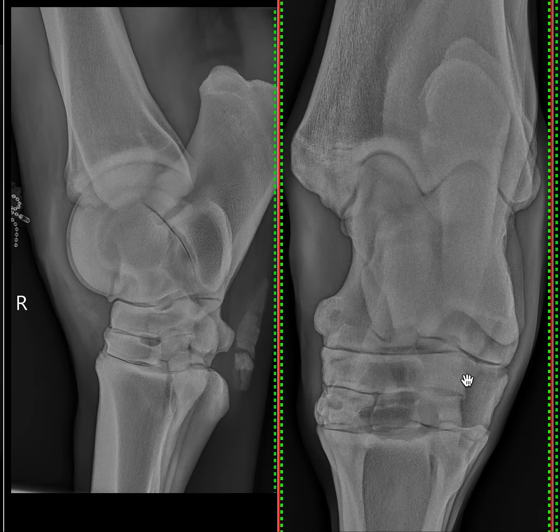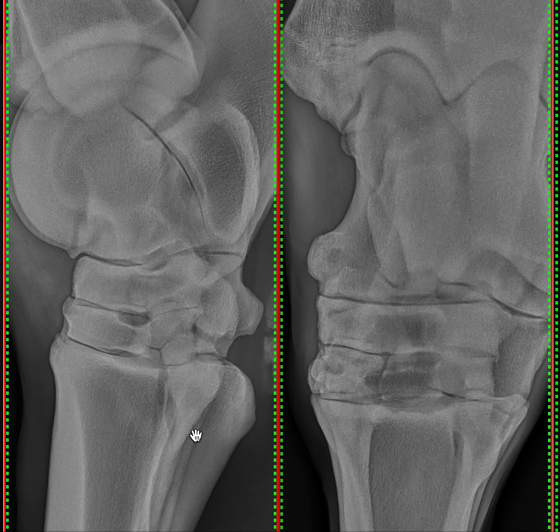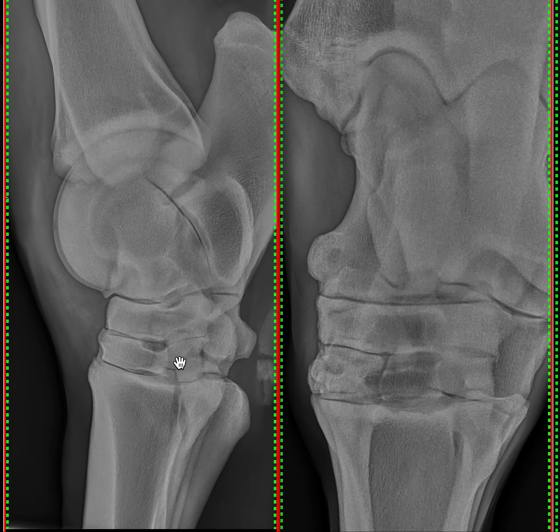The other findings that are of interest in this horse, you can see again on this dorsoplantar view, there's just a small amount of periarticular new bone formation associated with the distal intertarsal joint here. Just a slight bit of irregularity. I've said in the report that I think that's probably clinically insignificant. However, it's something to note and may need monitoring. There is a little bit of superimposition here on the dorsal aspect of the tarsometatarsal joint, and it could be interpreted as an osteophyte. However, I suspect that's probably within normal limits, so I wouldn't worry too much about that.